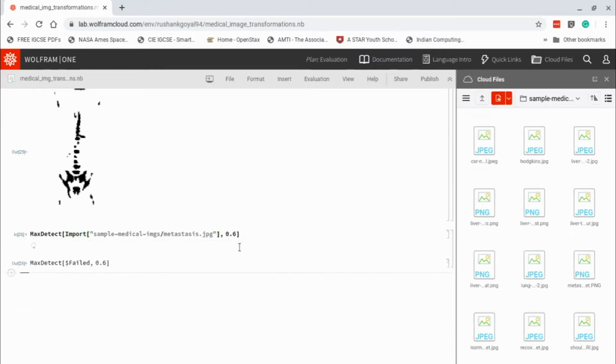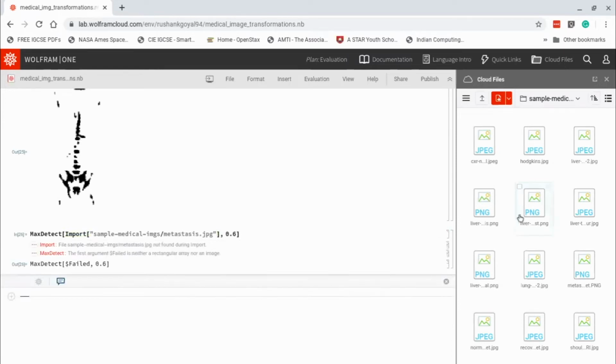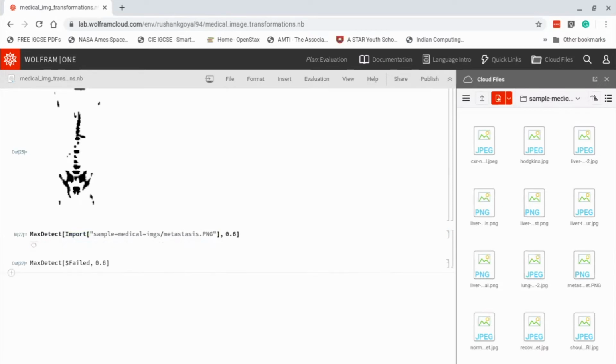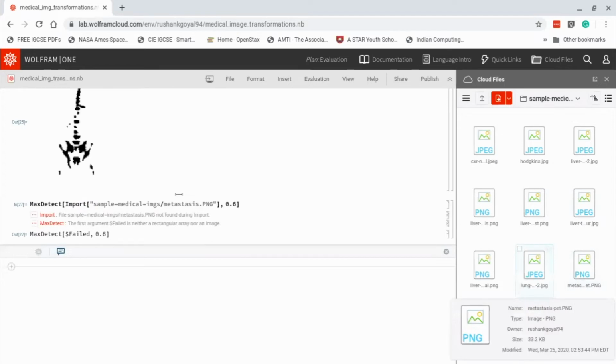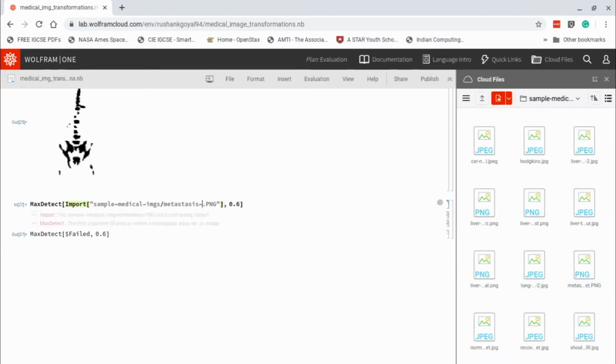So metastasis is basically, okay, let's see what the error is. Okay, it's a PNG. Yeah, metastasis. Okay, metastasis. PET.